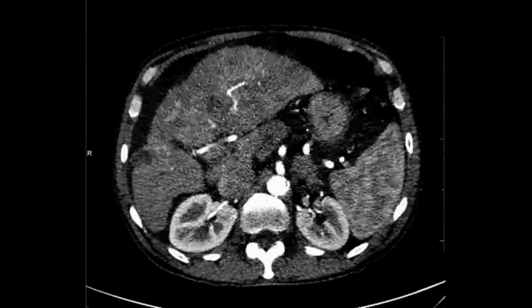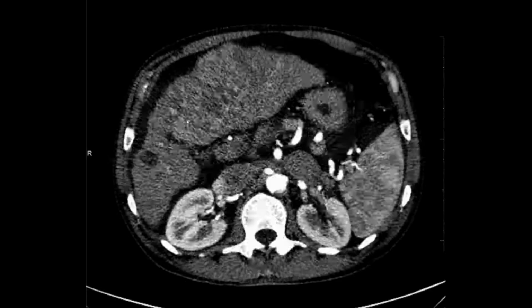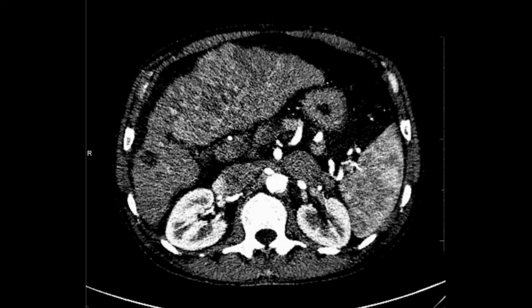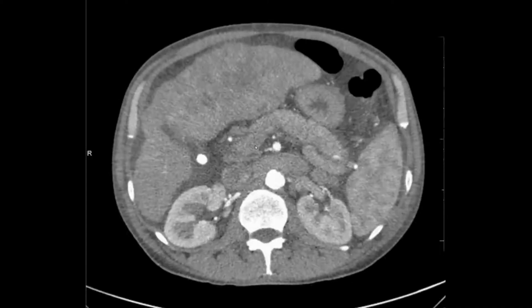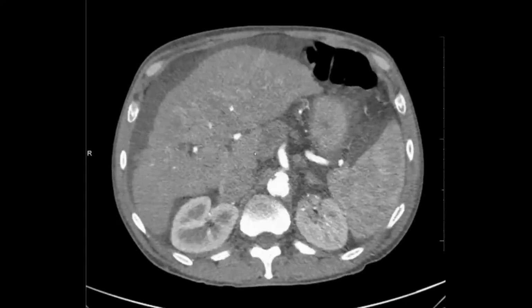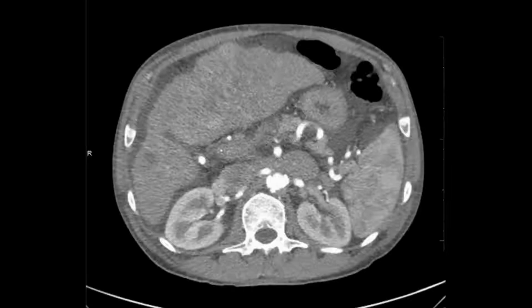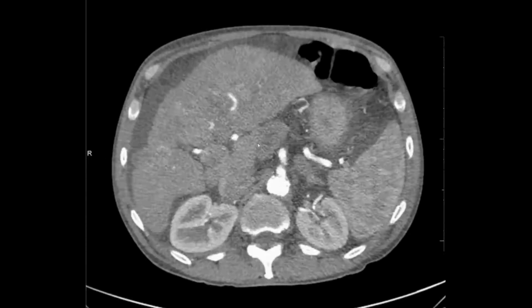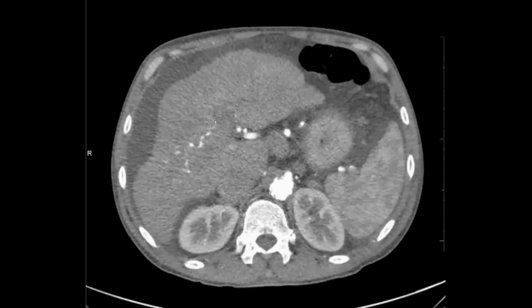our liver windows, you start to see a lot more exaggeration of the arterial enhancement that you can see here. And so to me, this is a giant tumor. And so looking at this again to evaluate for vascular invasion, or actually even just to see if this is a good study or not, you can see that the hepatic artery is opacified, but the portal vein isn't. And so as a result, that's telling me that this is kind of too early. But although we have very good reason to believe that there's something abnormal here.